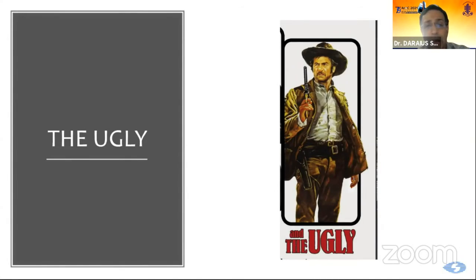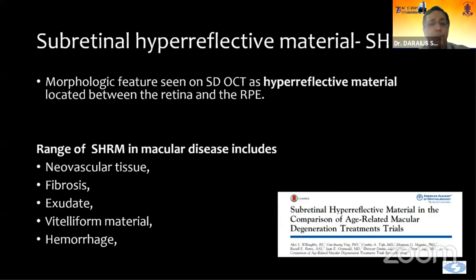Last but not the least, the ugly. So SHRM. What is SHRM? SHRM is a morphological feature seen on SD-OCT as a hyperreflective material between the retina and the RPE. It's a whole basket, like a waste paper basket. It's full of different things like neovascular tissue, fibrosis, exudate, vitelliform material, hemorrhage. All of these could constitute SHRM.